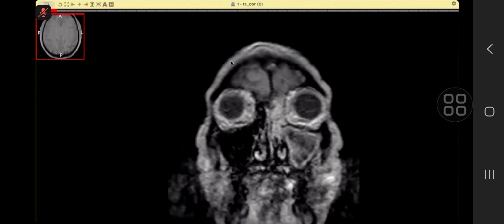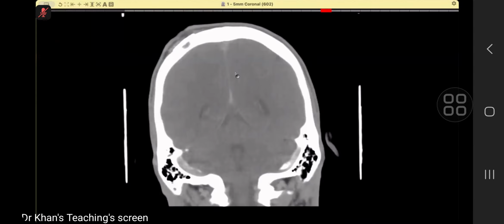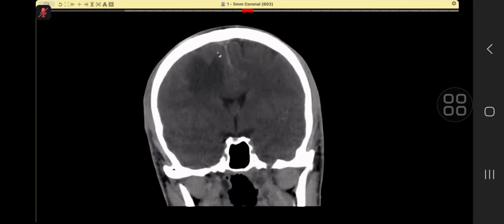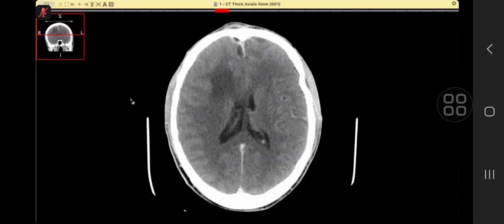This patient had a burr hole done from here. And we have got many post-op scans for this patient. You see the burr hole. This is post burr hole, by the way. You can see this burr hole, and you can see how the abscess has now increased. So initially the patient went from bad to worse, and then of course recovered.